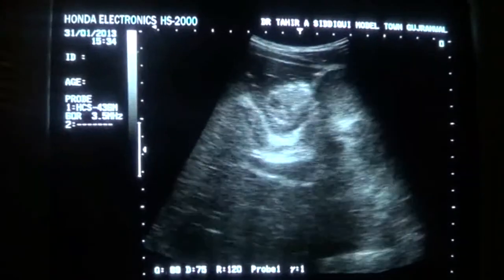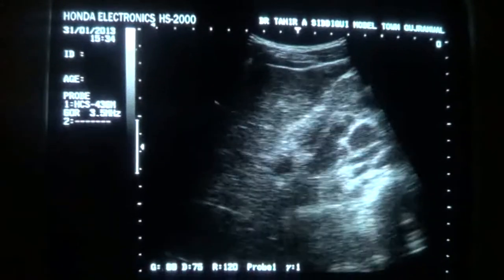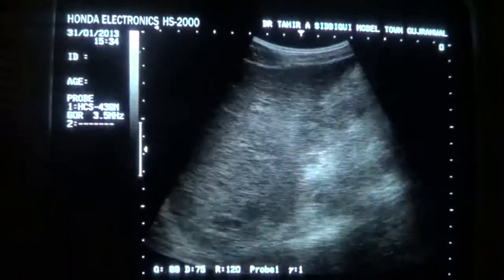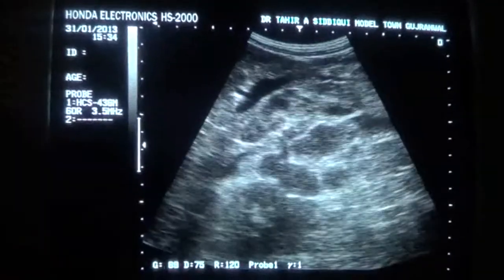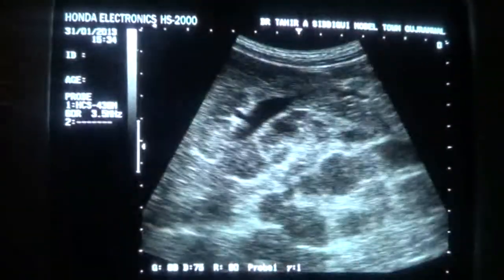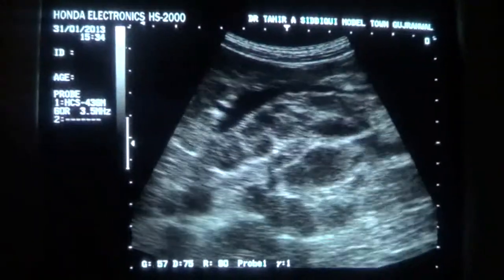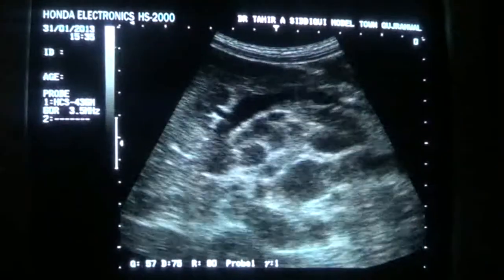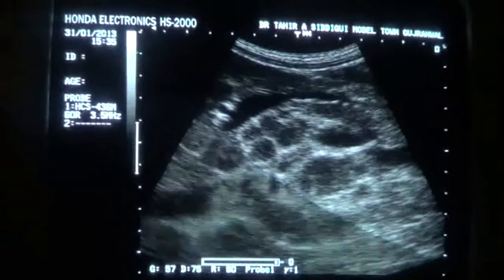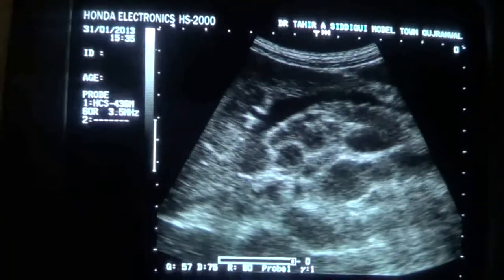However, second will be a blood dyscrasia, so it has to be correlated with the relevant lab profile. Now you see this is a magnified view of the lymph nodes in the paravertebral location. Thank you very much.